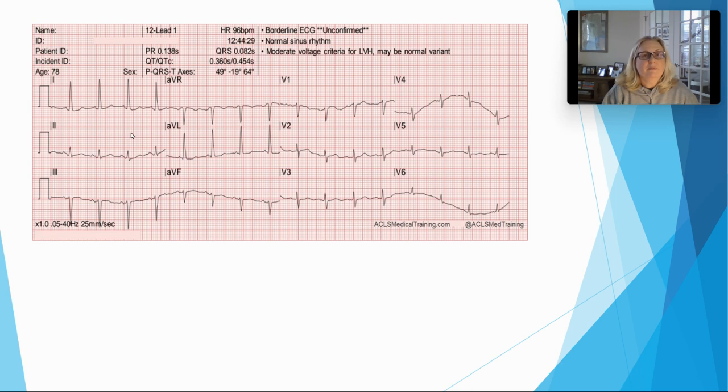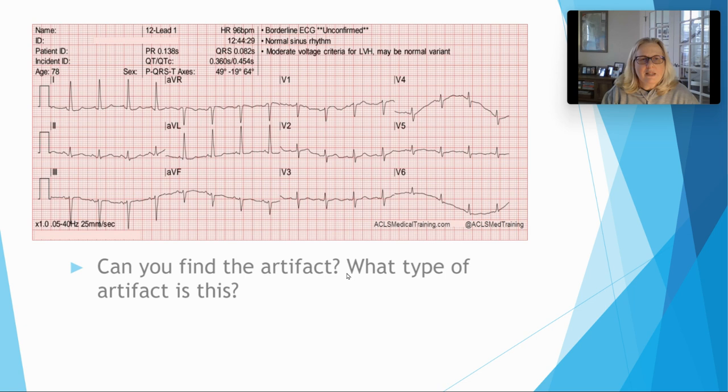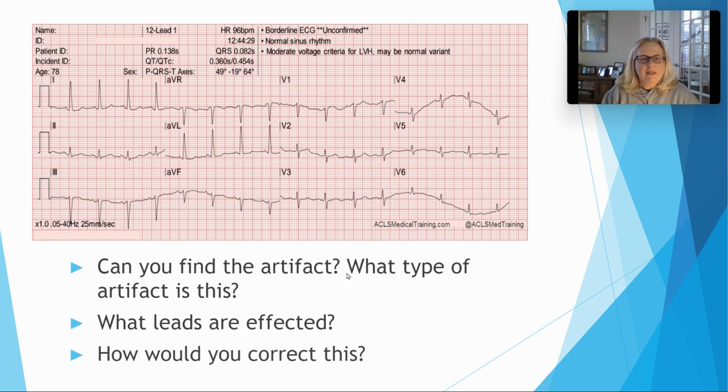All right, this type. Let's see, take a look at that one. Now you can see the difference. Have to think of what the name of that is. Okay, so this is nice and straight across until we get over here. It's wonky, really wonky here, really wonky here, wonky, wonky, right? So if you said wandering baseline, you are correct.